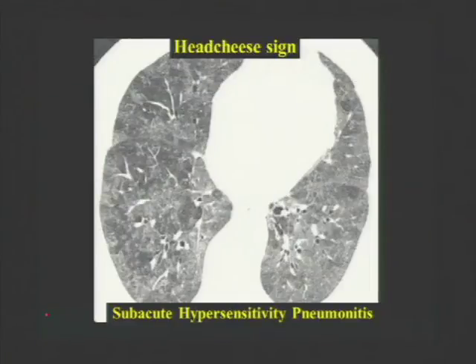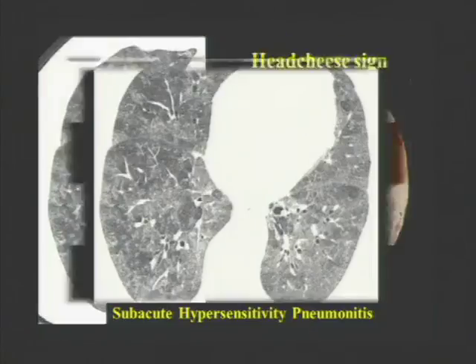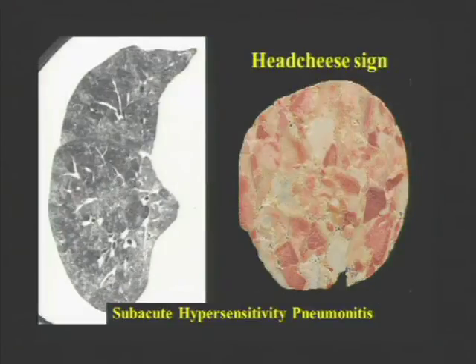Now here is another nice example of the Headcheese sign in subacute hypersensitivity pneumonitis. And this is why I call it the Headcheese sign.